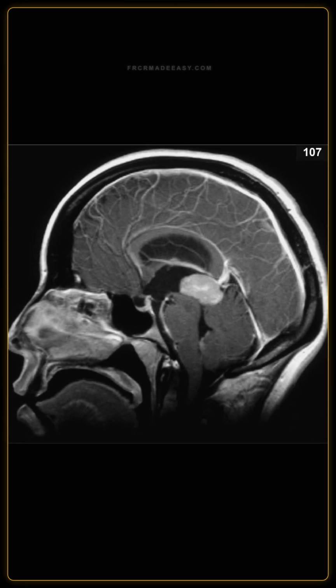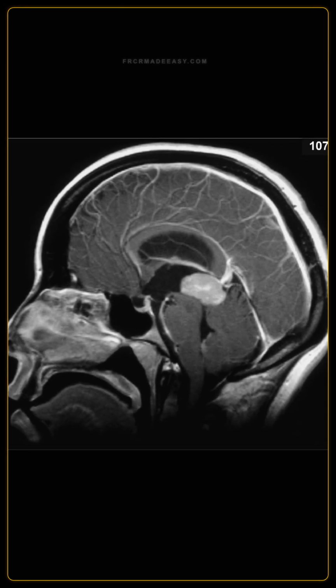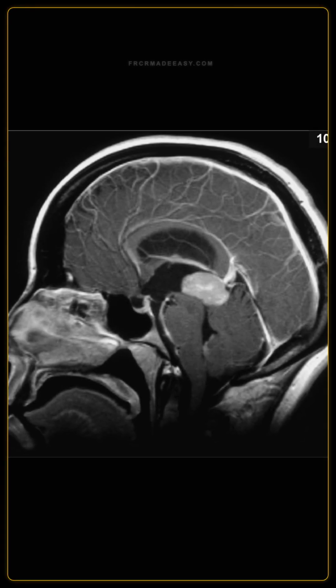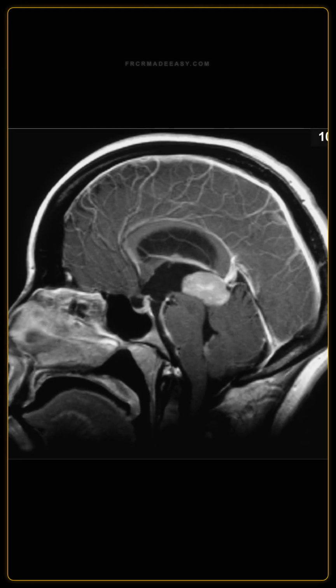A young adult male presented with headaches and paralysis of upward gaze. I am showing you a midline sagittal T1 weighted post-contrast MRI scan of the brain. Describe the findings.